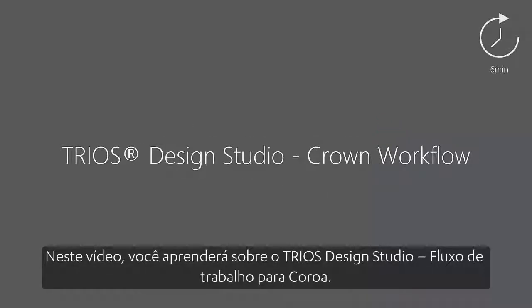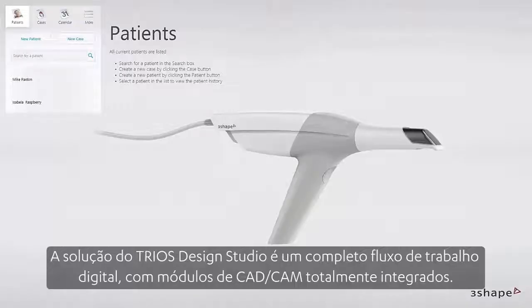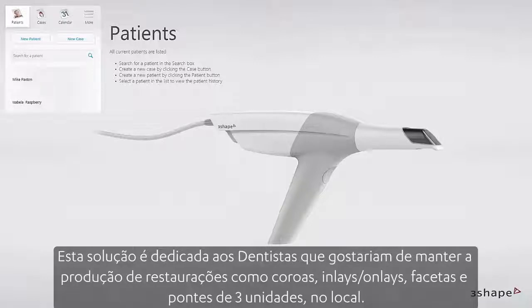In this video, you will learn about TRIOS Design Studio crown workflow. The TRIOS Design Studio solution is a complete digital workflow with fully integrated CAD/CAM modules. This solution is dedicated to dental practices that would like to produce restorations like crowns, inlay-onlays, veneers, and bridges in-house.